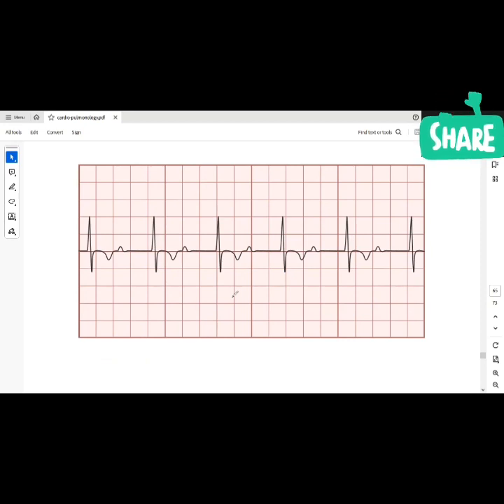Okay. The rate. Say like 4 boxes. You don't really need to tell me the number.